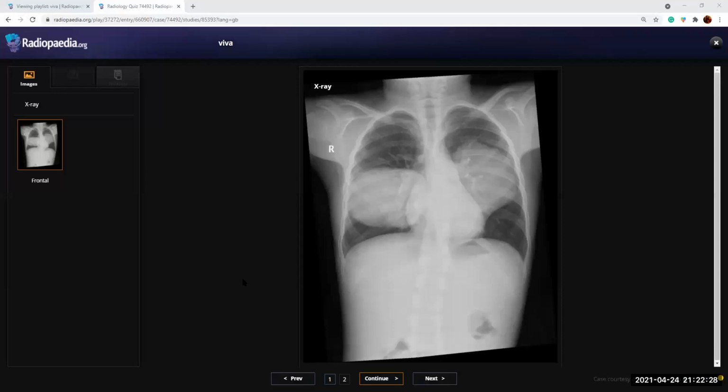This can be, but I'm not. This can be some, maybe cystic lesions in the lung, or any. Like what? Hydatid cyst is a possibility. Okay. Pardon? It is hydatid cyst. Pulmonary hydatid cyst. Yes. Pulmonary hydatid cyst.